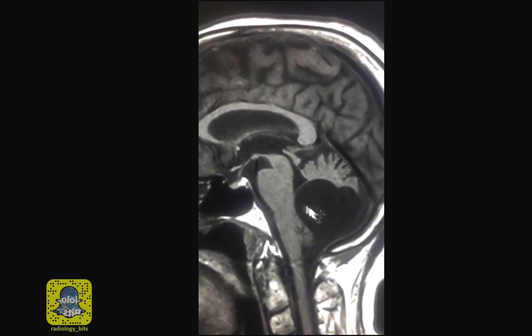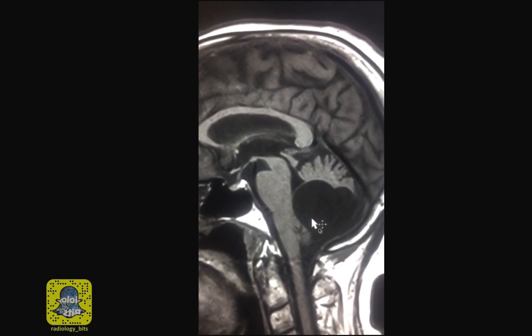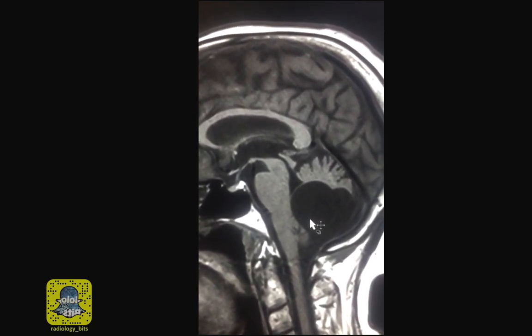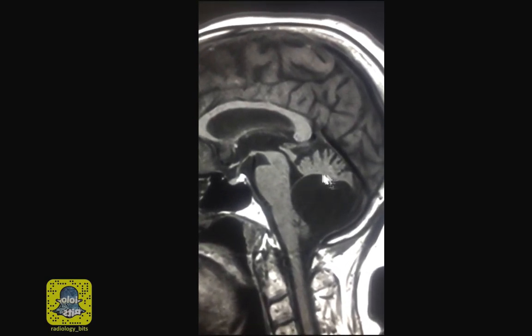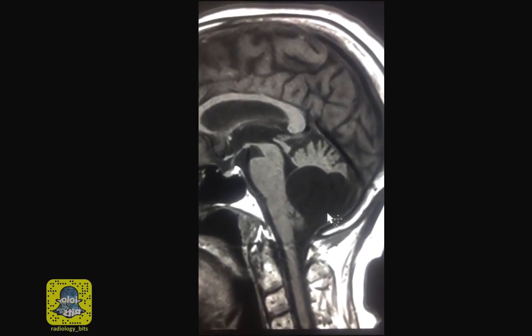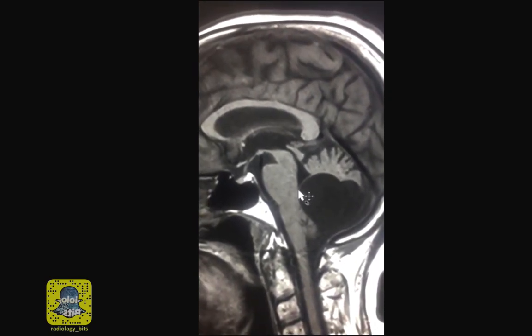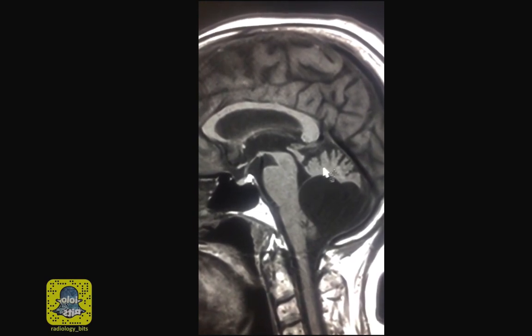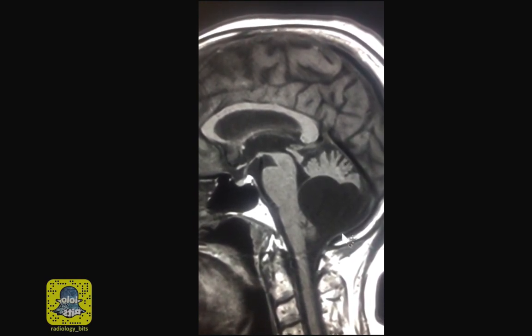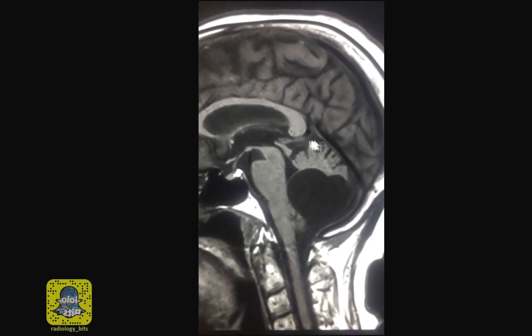have obstructive hydrocephalus. After making sure that the lesion is cystic and has no solid components, by looking at enhanced sequences, you have a classic differential diagnosis. A differential diagnosis of a cystic appearing abnormality in the posterior fossa includes mega cisterna magna, arachnoid cyst, epidermoid cyst, and Dandy-Walker malformation. Knowing the status of the fourth ventricle, the vermis, the size of the posterior fossa, and the location of the veins would help you differentiate these abnormalities.